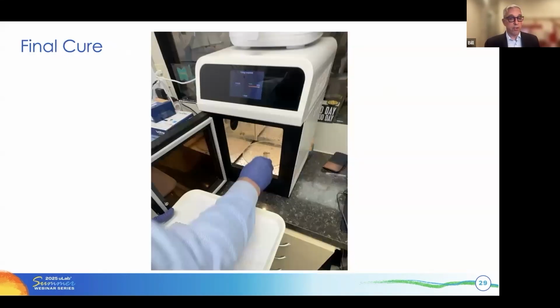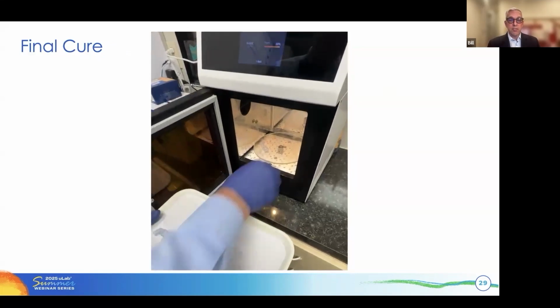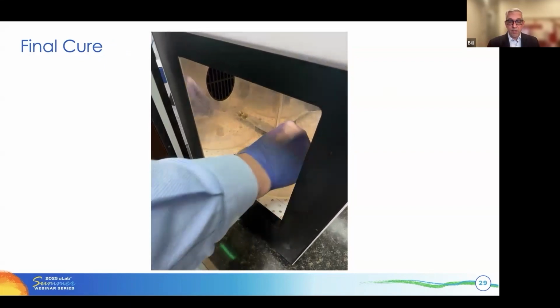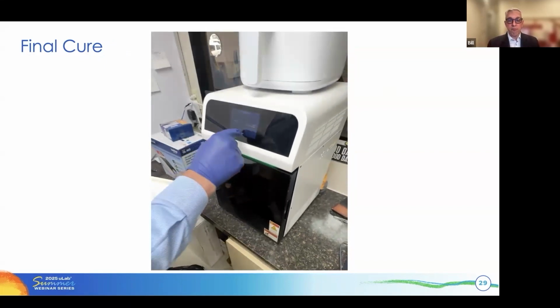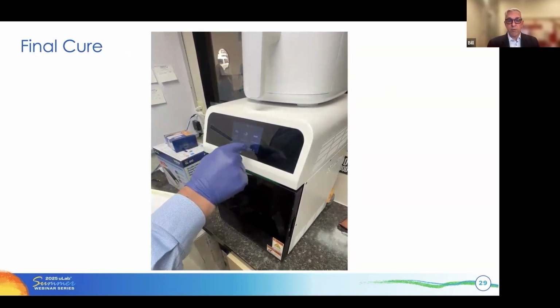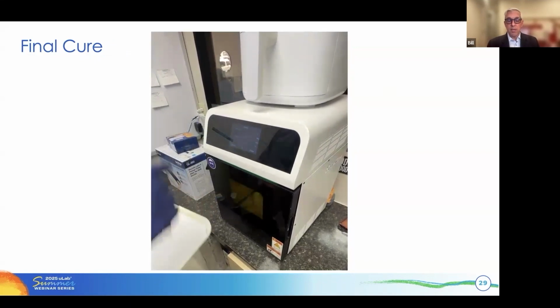After you go to this step, you're going to go to the cure step. And if you go to the cure step and you have any uncured resin in the bracket base on the cusp tip, it's not going to fit. It's not going to fit perfectly. And you've done all this work and now your bracket's off by a 0.5 millimeter. You don't have to do that. You can avoid that very nicely. And so, like I said, this is a 10-minute print with the Keystone IBT, which works out really nicely.